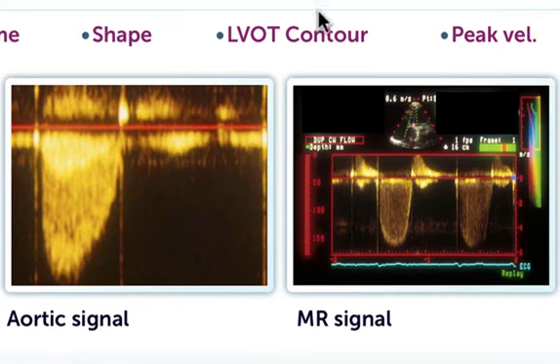Usually also in severe aortic stenosis you have a more dense signal. And furthermore, you can frequently see the LVOT Doppler signal in the contour here in the Doppler spectrum of the aortic stenosis signal.